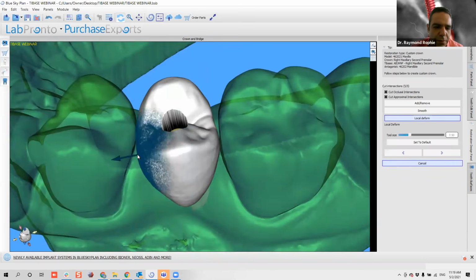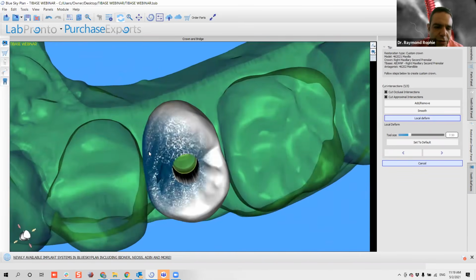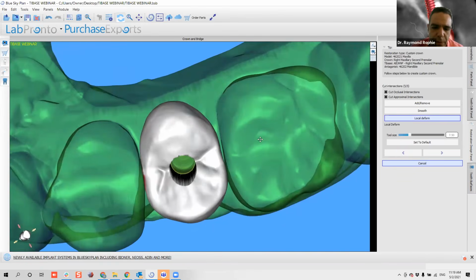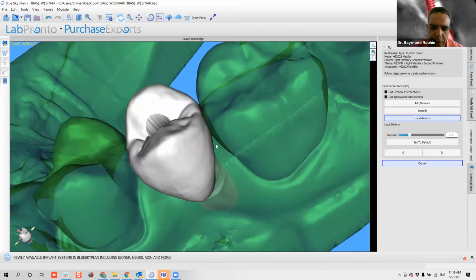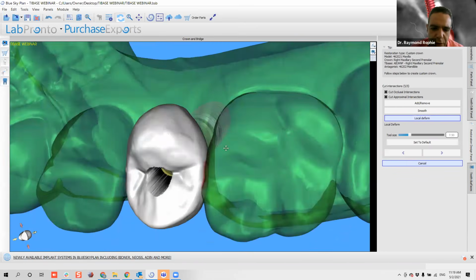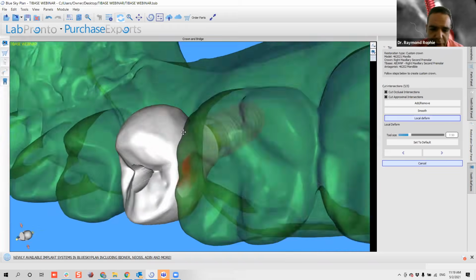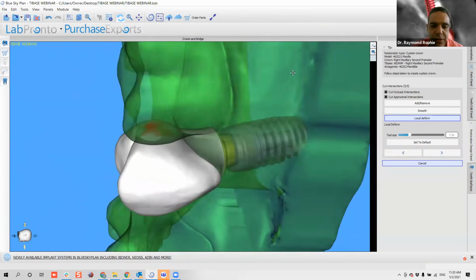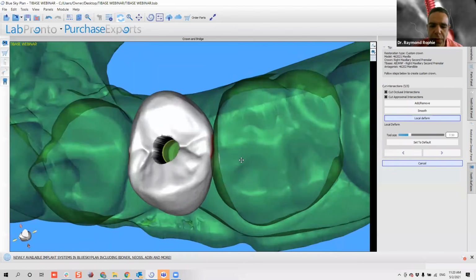And I will just change my interproximal surface to create a nice interproximal area. Okay, a nice contact area. Okay, good. Here it's, well, actually this is important. This is very good that happened. Okay, because now I can show you how I designed the crowns.